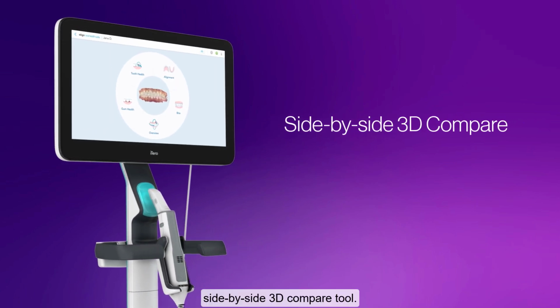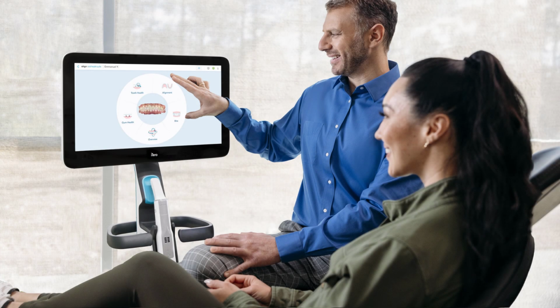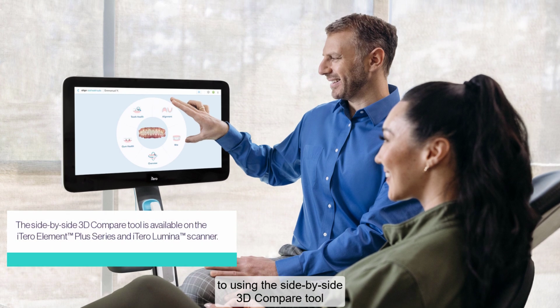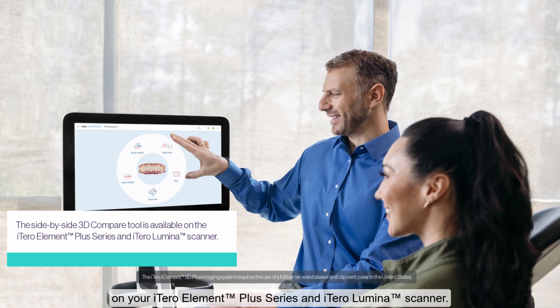iTero Side-by-Side 3D Compare Tool. This video guides you through the first steps to using the iTero Side-by-Side 3D Compare Tool on your iTero Element Plus series and iTero Lumina scanner.